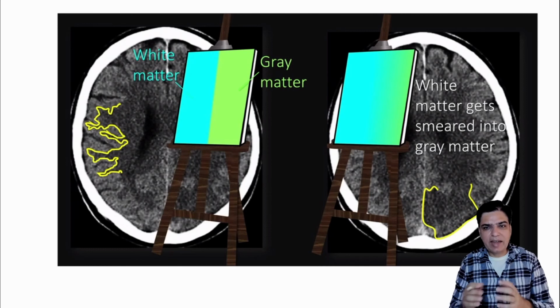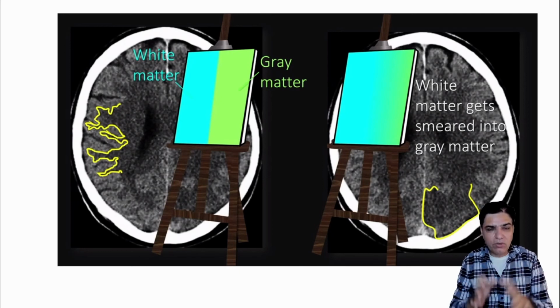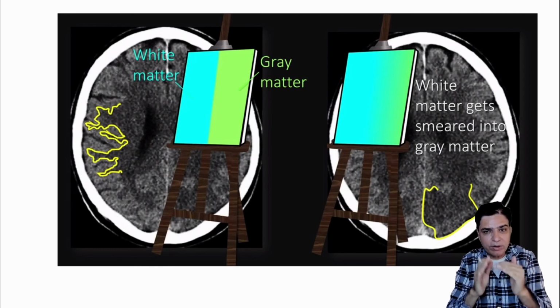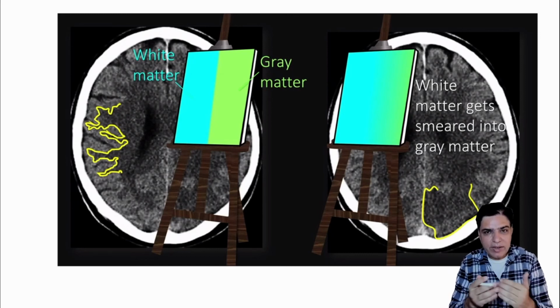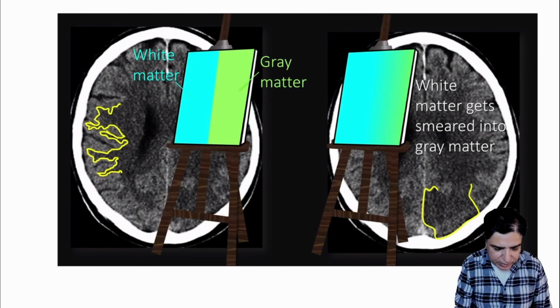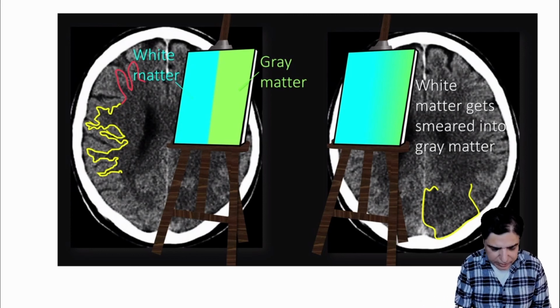If you see that the differentiation is lost, if you can't see clearly on one side or on both sides, that these arms of the octopus are not very clear, then the gray and white matter differentiation is lost. We call it that because it feels like a smeared one. Normally you can very clearly delineate between the gray areas and the darker areas, like the tentacles of an octopus, with very clear demarcation.